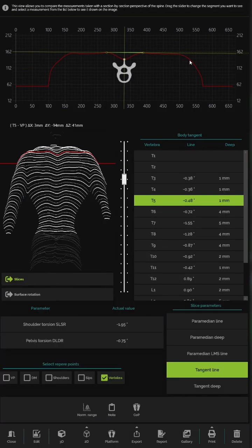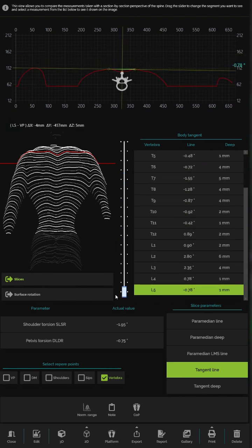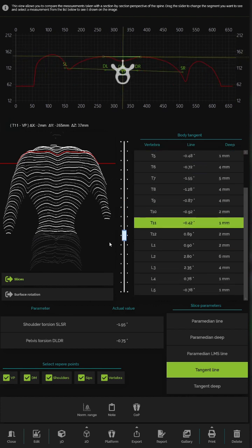We have already observed a mild degree of rotation on the other images, but this cross-sectional view is very, very good for demonstrating that. You can add these points on, which are the vertebral prominence at C7, and the shoulders. Then we can actually point in the PSIS, which are classed as dimples, left and right on here. And they can stay as a constant.